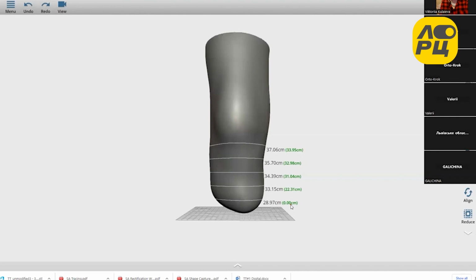In general, these numbers are automatically generated. These numbers in the parentheses come from the measurement form, so the remaining measurements carry over from the previous file where you entered your measurements. Understood, thank you for your answer.